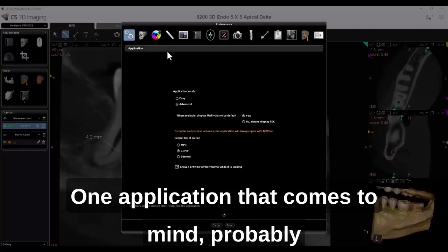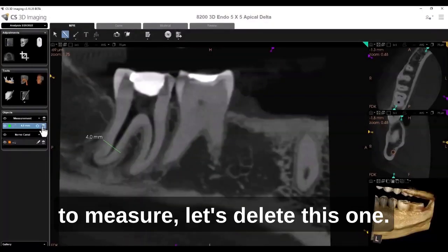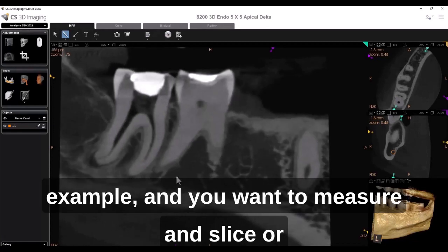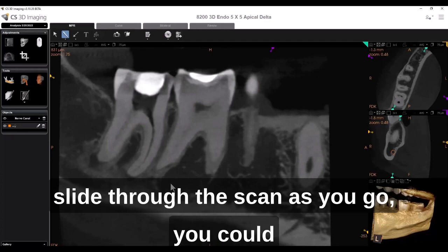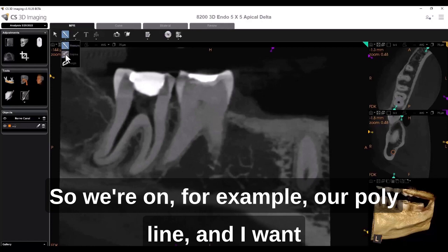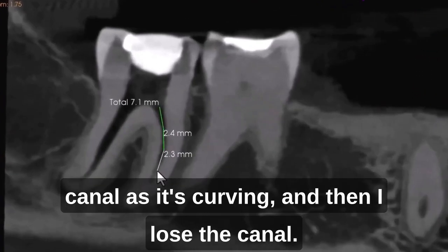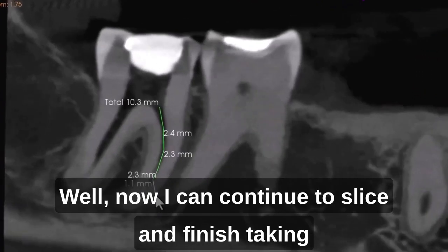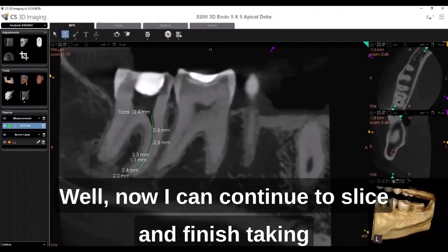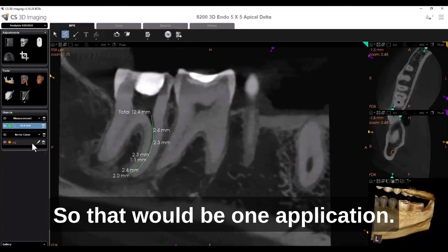One application that comes to mind, probably not too common, but if you're trying to measure, let's delete this one. If you're trying to measure a curved canal, for example, and you want to measure and slice or slide through the scan as you go, you could do that if it's attached to the volume. So we're on, for example, our polyline, and I want to measure here from the chamber. I'm going down the canal as it's curving, and then I lose the canal. Well, now I can continue to slice and finish taking my measurement to get a little bit more of an accurate measurement as you're slicing through the scan. So that would be one application.